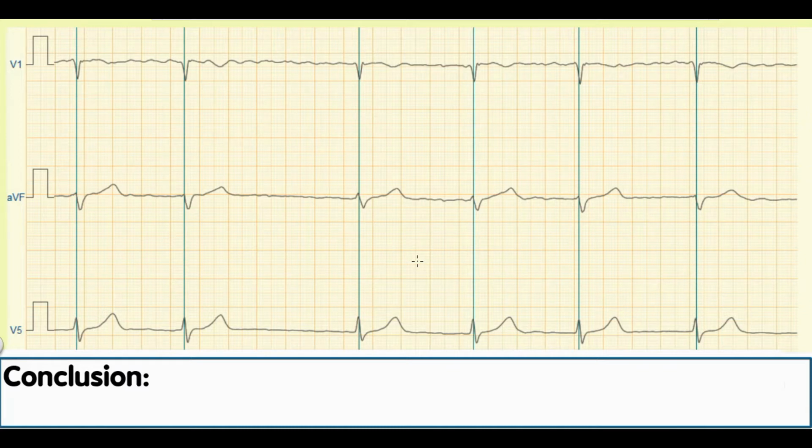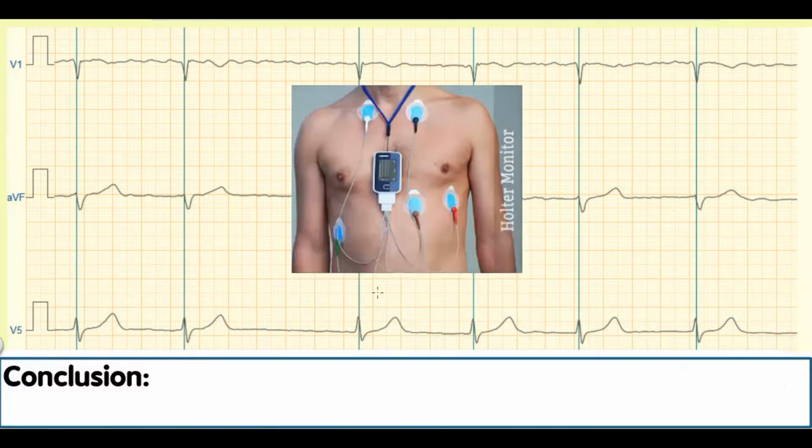As you see, this is not a full ECG, this is an example of Holter monitoring. Holter monitoring means recording of full ECG or some certain leads during some period of time from 24 hours to 7 days. It can be useful especially for detection of intermittent rhythm disorder. But a 3-lead strip has some limitations. For example, we can't normally examine the mean QRS axis.